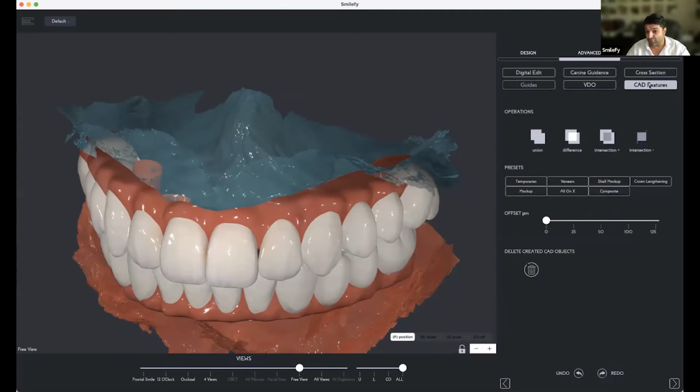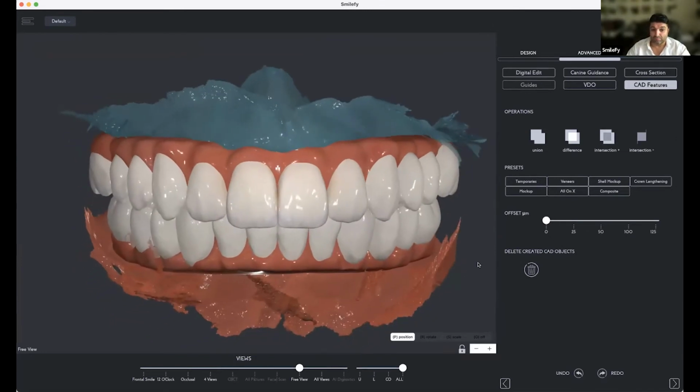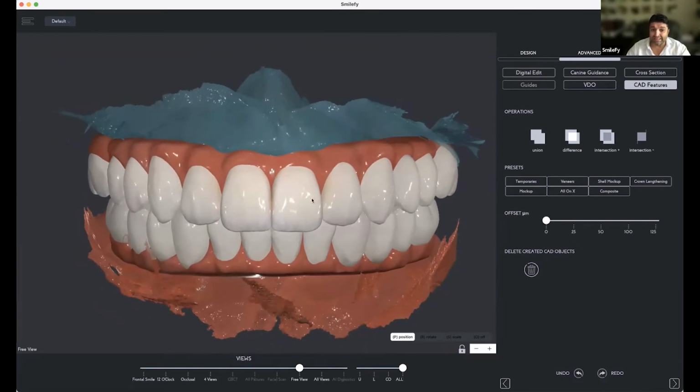And then you can do the difference between the pipes of the implant and the prosthesis. And then you get the full planning. I hope I can integrate also the implant libraries as soon as possible. So I talk to many companies now. If we can integrate also the libraries from the implants, then you have the scan bodies. You just exchange the scan bodies automatically with the full implant.